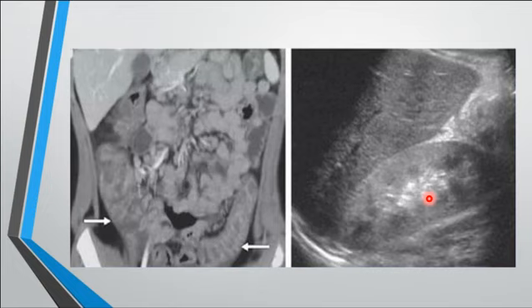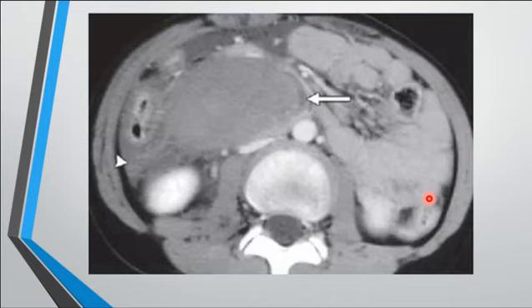Hemolytic uremic syndrome affects the bowel, and the uremic part affects the kidney. So there is a kidney abnormality plus a bowel abnormality. In most of the cases, it will be due to hemolytic uremic syndrome. In this case, it was due to E. coli infection in a child. Okay? Only young age, not an adult. Hemolytic uremic syndrome. I'm just giving you all the appearances of bowel wall thickening due to different pathologies.